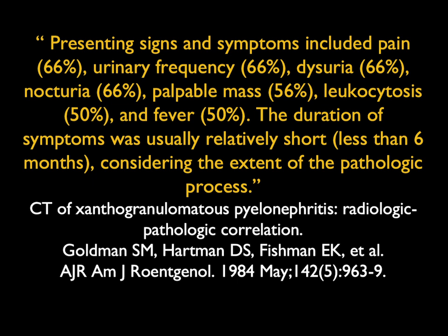Now, of course, one of the things that's changed is 84 was a good example. You didn't do CT very frequently. Now patients have fever, flank pain, you're getting a CT right away or some imaging modality, but especially CT. So you're probably not going to see, although we occasionally do, the really crazy cases we saw in the past, but we still see some of them.